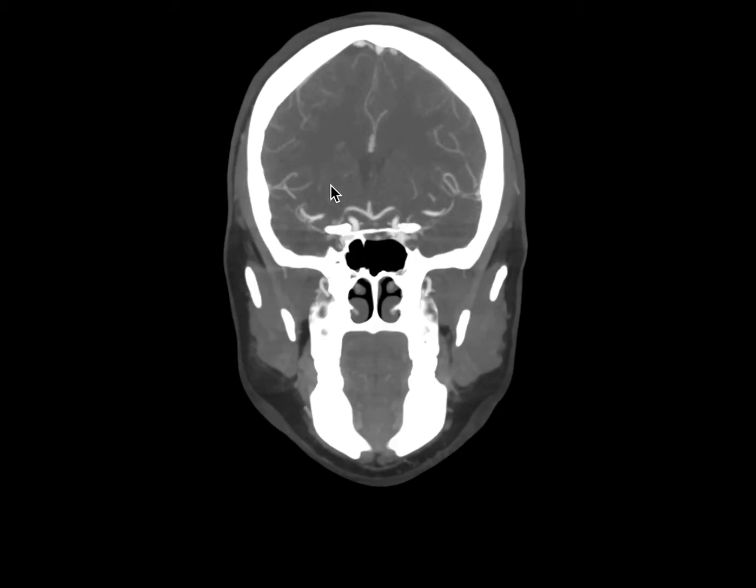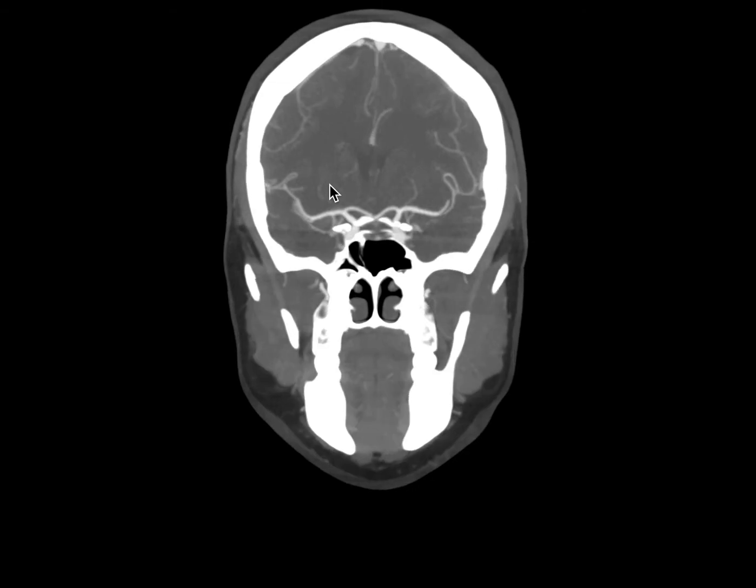left. Going back posteriorly, the middle cerebral artery M1 segment will extend from the internal carotid artery terminus to the anterior aspect of the insula, or alternatively, its endpoint can be defined by its branching point. Usually, it bifurcates, including in this patient, into 2 main branches, though trifurcation and more complex branching patterns are also seen. The M2 segment will extend from this point here and then go posteriorly and superiorly up the sylvian fissure.